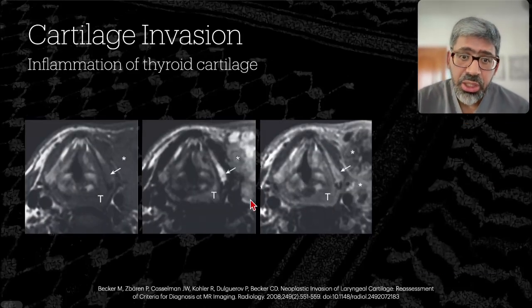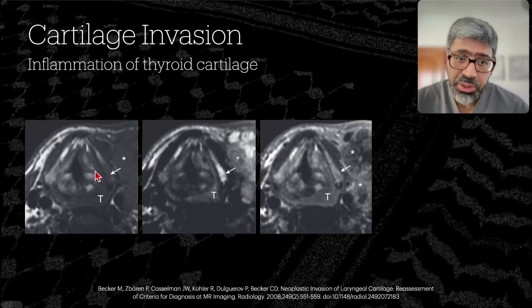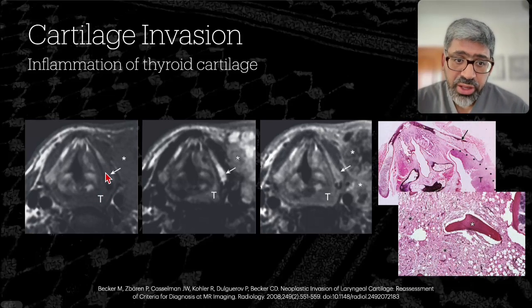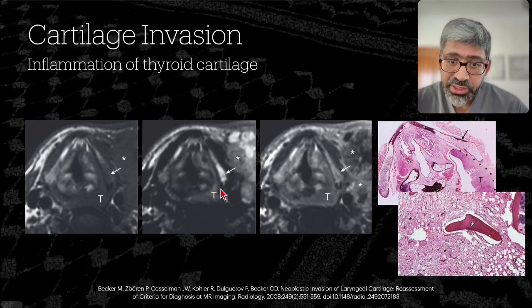confirmed by pathology, as opposed to this mass where the tumor infiltrates into the posterior paraglottic space at the glottic level. But at the same time, you see abnormal signal within the left thyroid cartilage lamina marrow, which on T1 looks similar to the original tumor. On T2 definitely looks different. The tumor has intermediate signal on T2, while this component has really bright T2 signal.